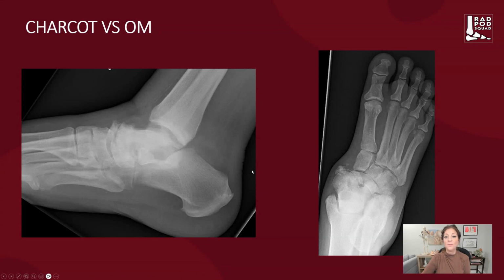This was a patient who presented with Charcot versus osteomyelitis, comes with pain, a swollen foot, and we can see right away on the x-ray that the posterior subtalar joint is malaligned. We have the sclerosis, fragmentation, and debris. There are bone fragments here that are articulating with the navicula, suggestive of a talonavicular Charcot neuropathic dislocation. And of course, the AP view certainly shows that medial dislocation of the talar head, fragmenting the navicula and fragments here in a patient that is consistent with Charcot fracture arthropathy.